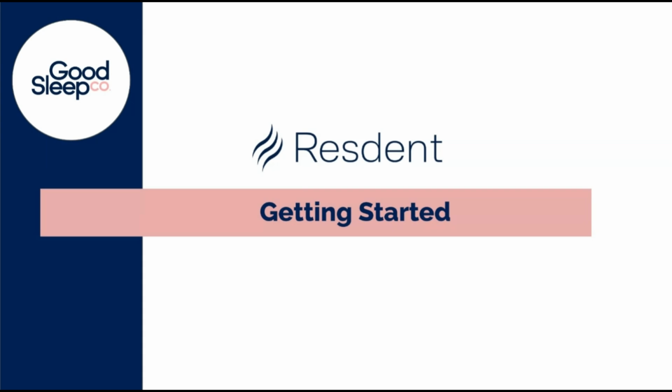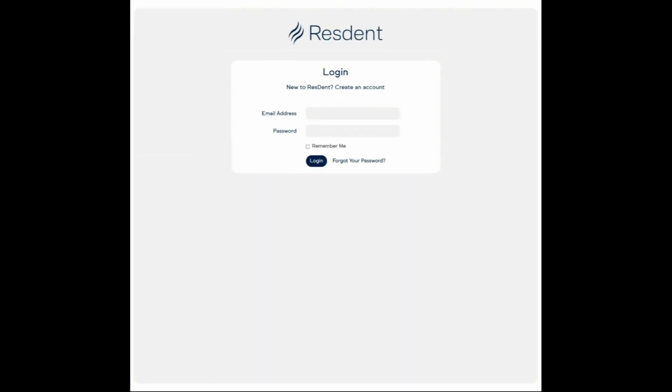In this video, I'll be showing you how to set up an account, create clinics and patient records, and submit orders through the platform. To begin, open a browser window and in the search bar, enter app.resdentapp.com/login. This will bring you directly to Resdent's login page, so I recommend you bookmark or favorite this window for future reference.